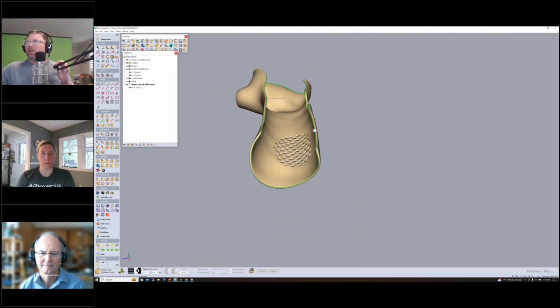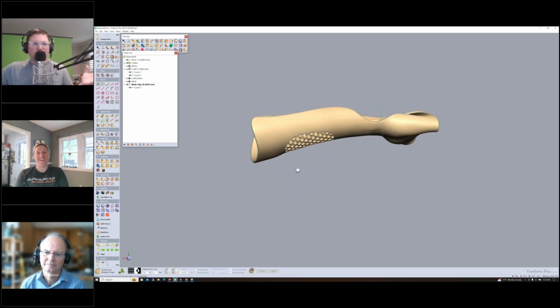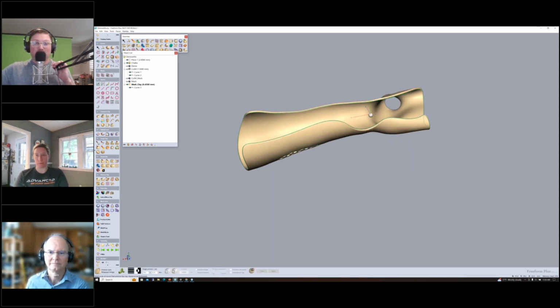So this is not the most beautiful wrist hand orthosis, but it gives you an idea of what is possible. It took me maybe 7-8 minutes to do, talking all the way through it and talking about the haptic device, but we're at something that's printable very quickly, the way that I want it, which is what I love.